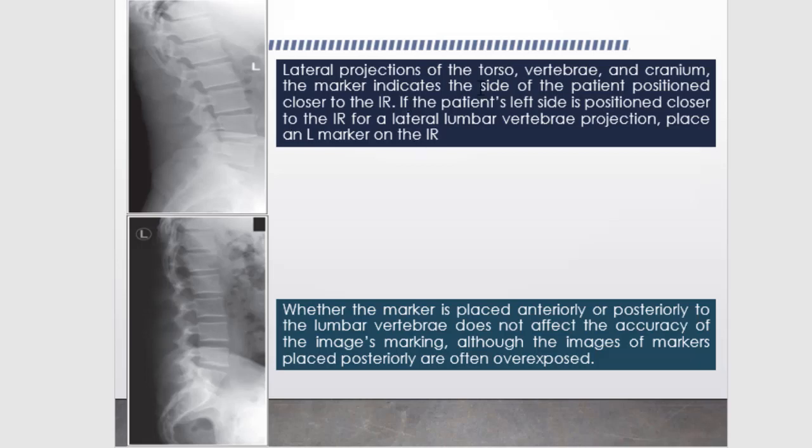Okay, if the patient's left side is positioned closer to the IR for the lateral lumbar vertebral projection, place the left marker on the IR. For example, like this case. Okay, you see it's not superimposed.